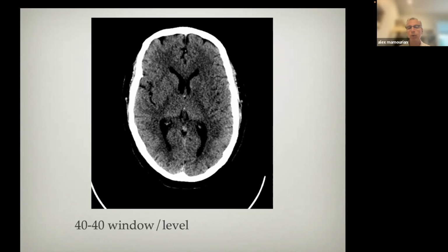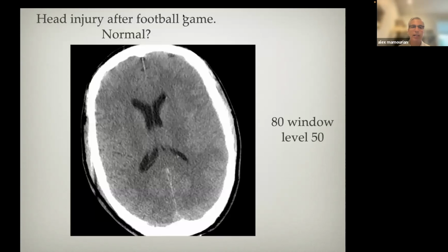It goes through the foramen of Monro. I'm not sure what your education or understanding of that is, but my understanding is that we were generally taught that the choroid plexus goes from the lateral ventricle into the third ventricle. But in fact, further investigations have shown that the choroid plexus lives in the velum interpositum, which is the space where the internal cerebral veins are. But anyway, this nice depiction of gray-white interface and basal ganglia is facilitated by using a narrow window at the level of the brain itself.